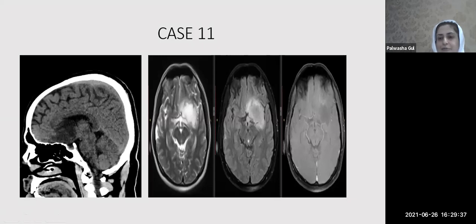And he said, Palwasha, if you're going to see contrast enhancement and then think that you are dealing with a tumor, then you are doing a wrong thing, because most of the CNS tumors are gliomas. Most of these are grade 2 and grade 3, and these would not be showing contrast enhancement. Mostly these would not be showing contrast enhancement. Okay? So let not the absence of contrast enhancement make you think that you're not dealing with a tumor.